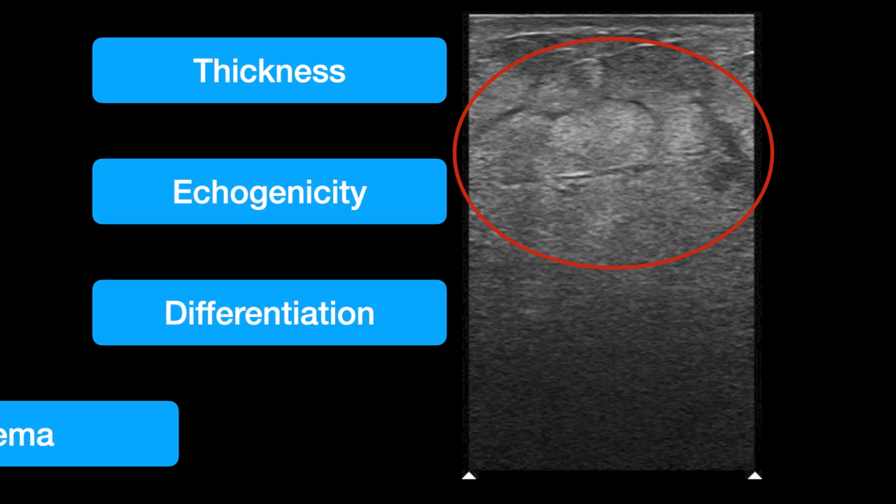The third one is a change in the differentiation of that marbled appearance. We showed the image of that very veiny, marbled appearance of the subcutaneous tissue, and we're going to see that in normal. But as we make this tissue inflamed, as everything's swollen and laden with all that fluid, we're going to lose that differentiation of the marbling, right? And it's going to become a more homogeneous-appearing echotexture, like what we see here, right? It's decently homogeneous.